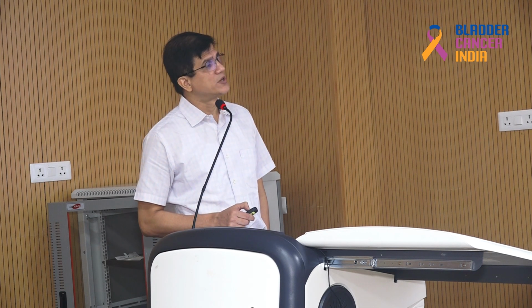Again, some part of radiophysics. Here what we see is that this is a hypo-intense muscular layer on a T2 weighted image, but on enhancement, initially it is hyper intense and subsequently it becomes hypo intense. So initially the muscle and the mucosa both enhance in a similar manner, but at a later stage the muscle starts becoming hypo intense, while the mucosa remains hyper intense.